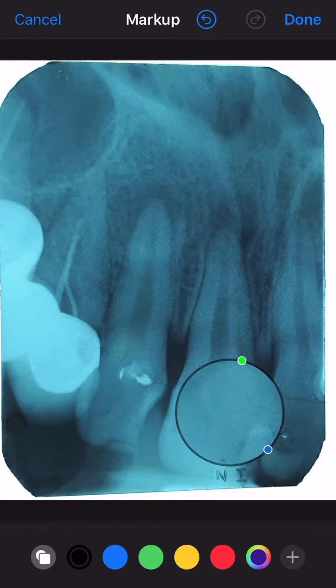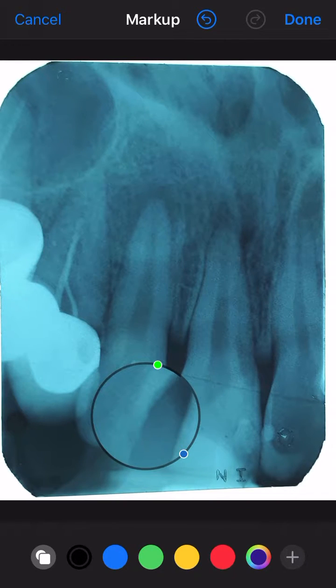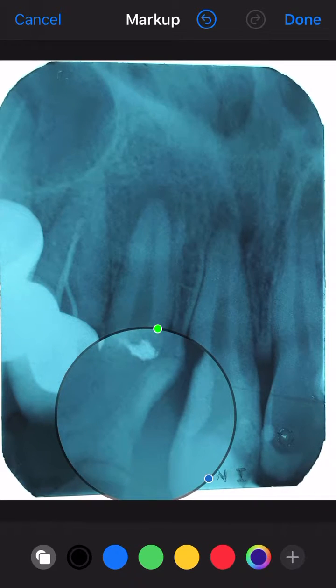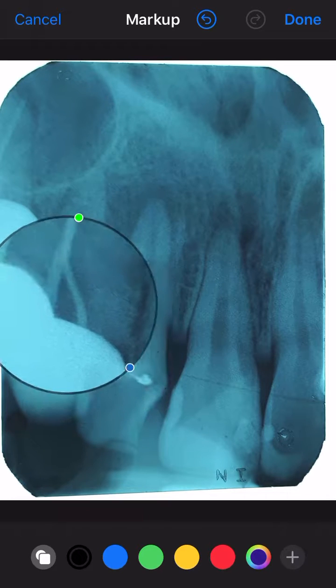Radiolucency involving the pulp. And then in the adjacent tooth, it looks like a fractured restoration. Yes, fractured restoration involving the... Is it involving the pulp? What is that radiopacity there? Restoration. Probably on the lingual side. Yeah, on a radiograph, you can't really make that out. And then move on to the next part, the roots.